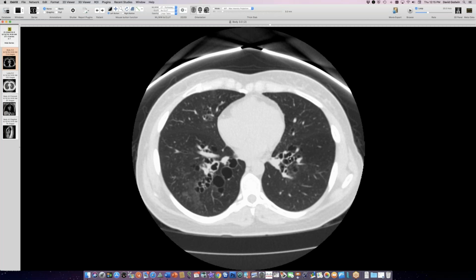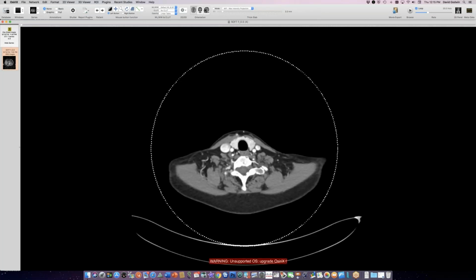Yeah, I agree, David. I think of it as sort of the end result of a variety of insults or predispositions in the lung that lead to breakdown of the normal airway integrity, and you get that scalloping that you nicely pointed out. I've seen cases where the diameter isn't that great, but the contours are quite abnormal and there are varying degrees of bronchiectasis. And when I think of it as congenital, I don't think you're born with it, but I think some causes, maybe connective tissue abnormalities where they're lax or there's deficiencies in smooth muscle, and then it develops from there, right?